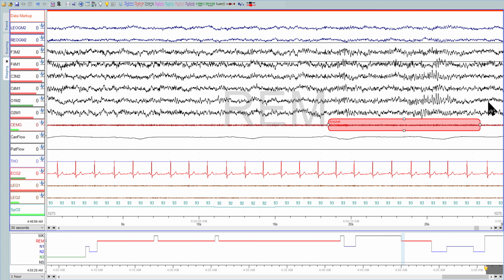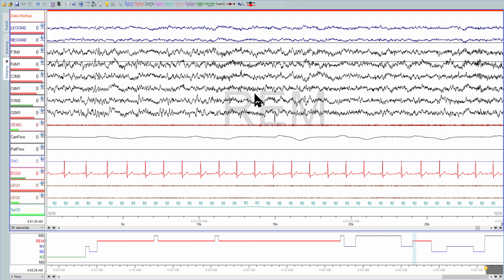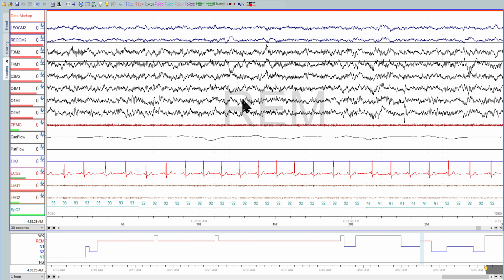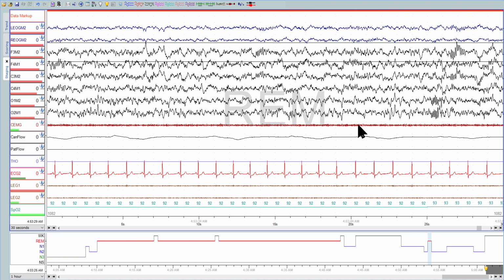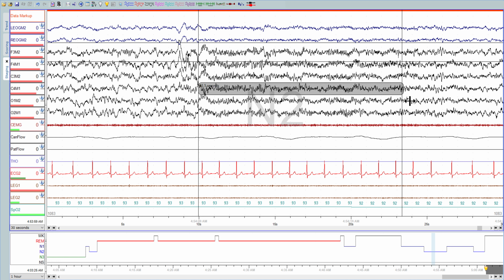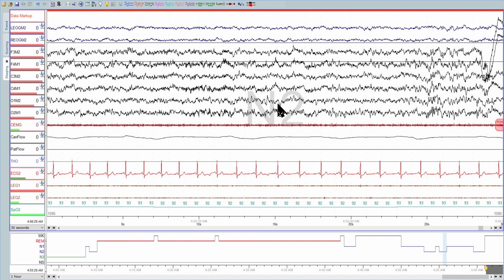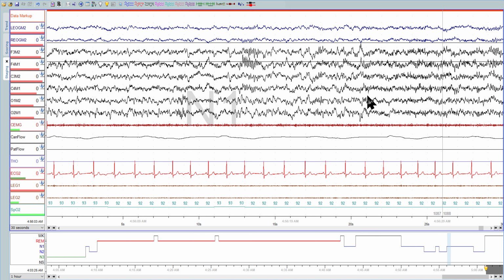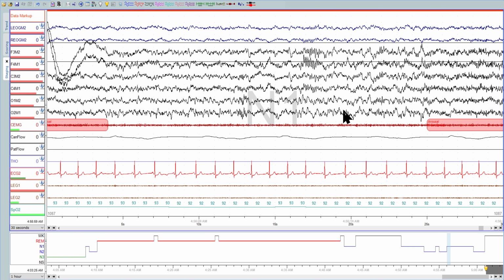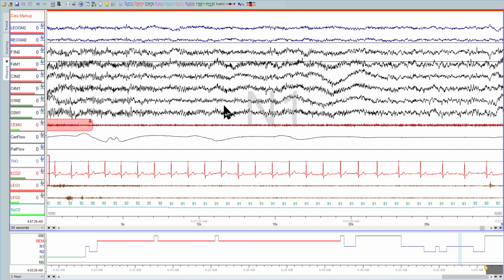And into some stage one with an arousal here. Again, some one, one, one, one, one. Spindle for two, two. Arousal for two, two, one, two, two. So spindle here. We got another arousal here. And keep this as one like you have it, and this one two, and this one two.